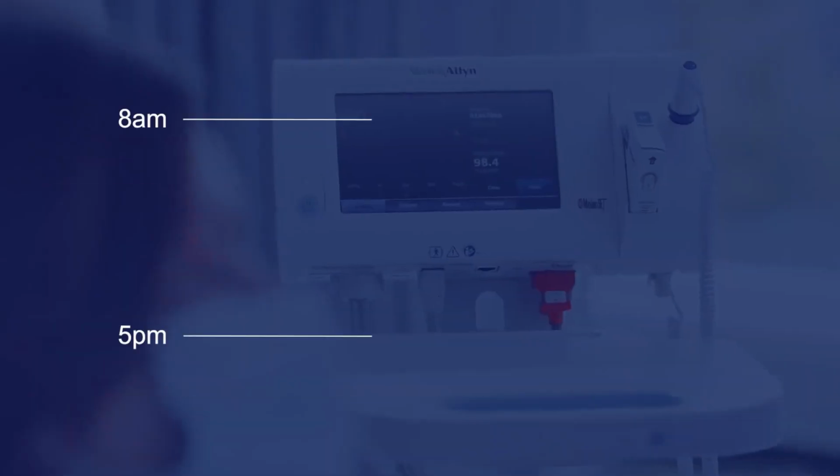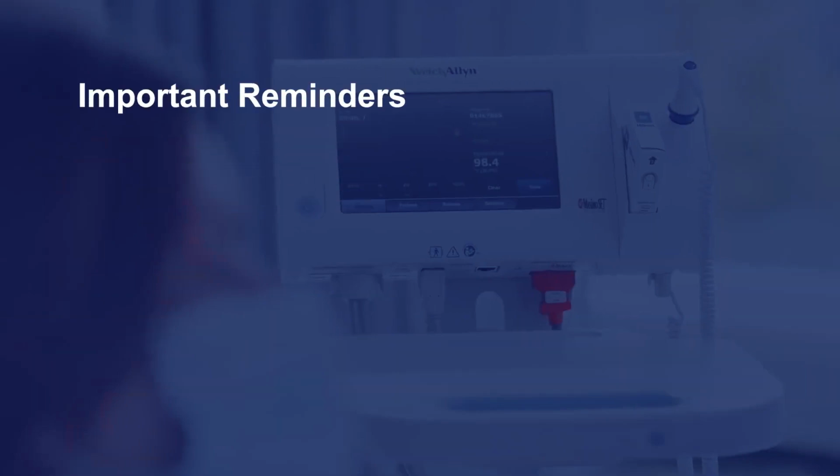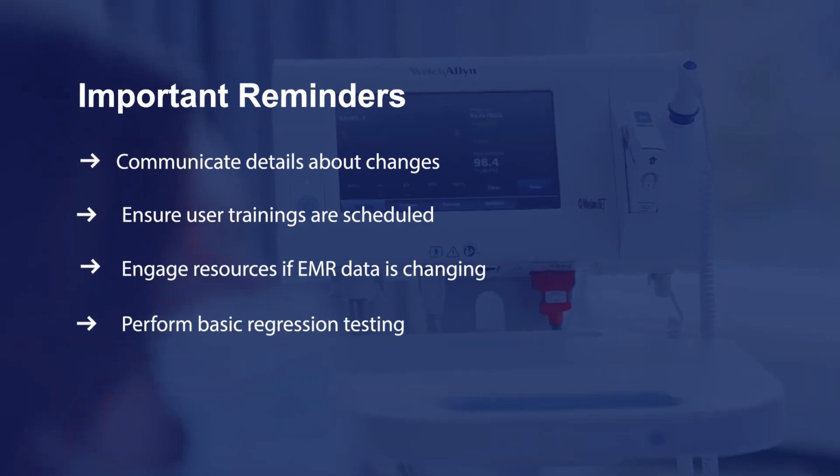Make sure the scheduled deployment time is during normal business hours, when resources, including Baxter technical support, are most likely available. Work with your interface team and clinical partners to ensure the change has been communicated, user training is scheduled, and proper resources for the interface have been engaged if changes to the data charted to the EMR are part of the deployment. Before deploying to your production system, be sure to perform basic regression test cases to ensure the updates or upgrades work correctly in your sandbox environment.